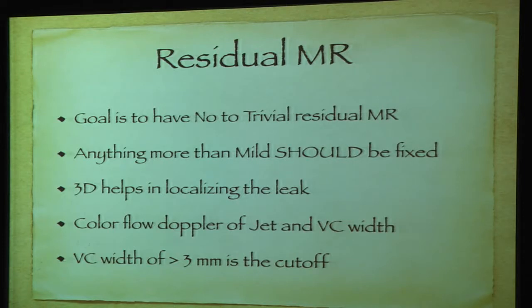First of all, any MR is bad, period. Okay? Any MR, long course, you're going to have high morbidity, high mortality. So any MR is bad. Mild, none to trivial is okay, but anything beyond that is not good. So we need to reassess that, what to do about it. 3D, of course, helps in localizing the leak, where the leak's coming from.